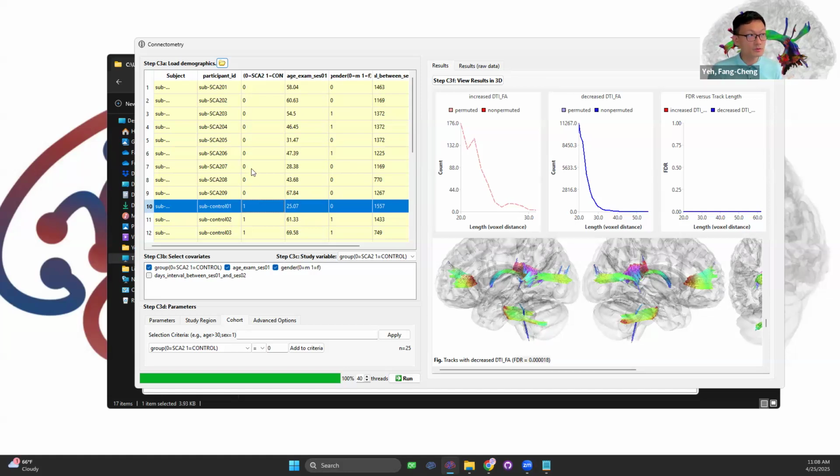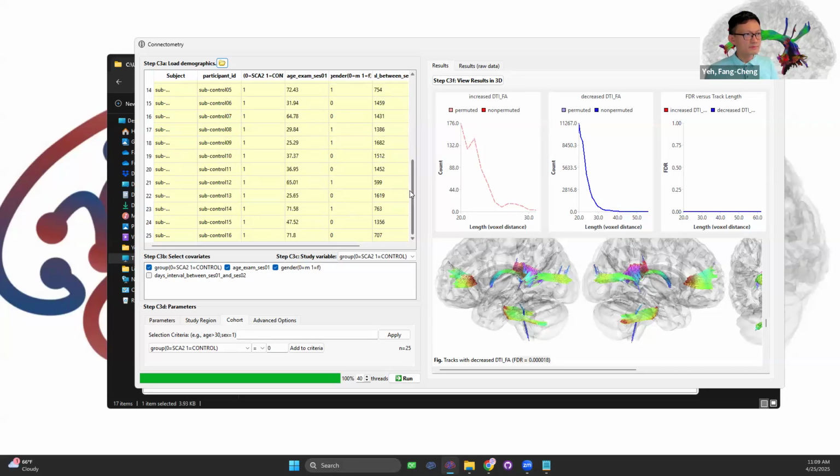So if you want to do a group comparison, then the positive correlation could have increased FA missing in here that causes an analysis problem. And that's a scenario where we want to filter out the increased FA in the database so that when we test the correlation, the positive correlation won't also be testing the positive increase of FA in the follow-up.